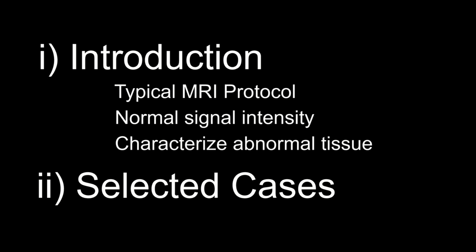There is also an explanation of the pathology and some key learning points. So for example, in this case of bilateral dermoids, we talk about related pathologies that you need to know and the basic MRI principle of how to identify and characterize fat on MRI, including differentiating bulk fat from intravoxel fat.